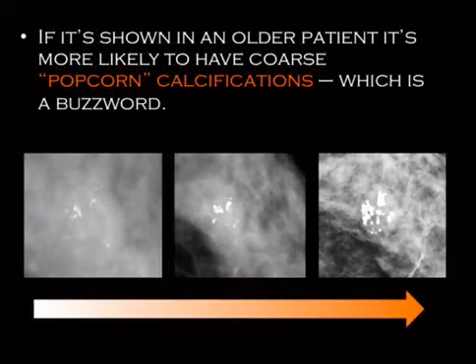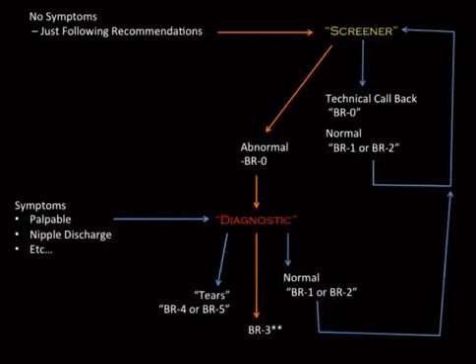So this is what we're looking at here. These are 3 mammogram x-rays taken of the same patient over a course of time. You can see these peripheral calcifications occurring more and more over time. So this is what you expect. That does not make it more suspicious. That makes it less suspicious. So you can BI-RADS 3 this on a baseline exam. If you see something like that and it's not a baseline exam, you have to BI-RADS 4 it.